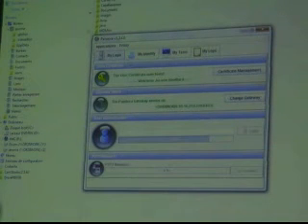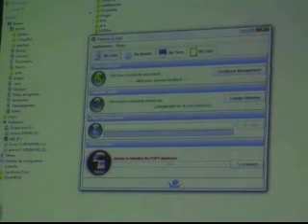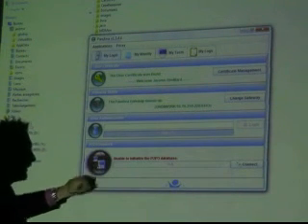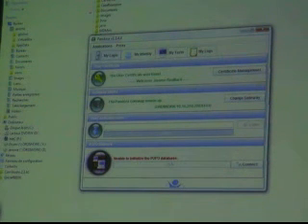Alright. So, once this is finalized, you are connected to the system. There is a fourth part that I will not explain today, which is additional connectivity that you obtain once you are authenticated, which is for the moment not important. We will explain it later.